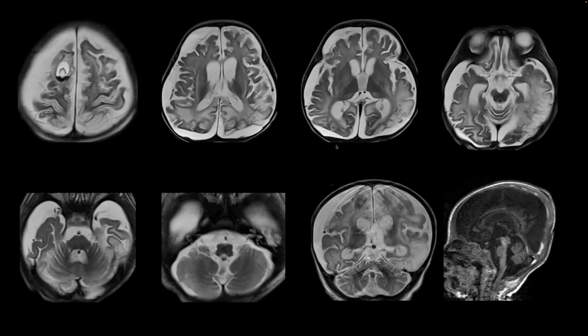So in the current scan, the subdurals are because of cerebral atrophy. Right? Yeah, because of the atrophy, it causes injury to the bridging veins, and that causes the subdural collection. So I think Dr. Mahesh, I don't know if he's there, was concerned whether these subdural collections need to be drained. If they're because of atrophy, they probably do not, right? No drainage at all. There is no reason. There is no pressure. This is atrophy. And the last question, is 20 days enough to cause this much atrophy?